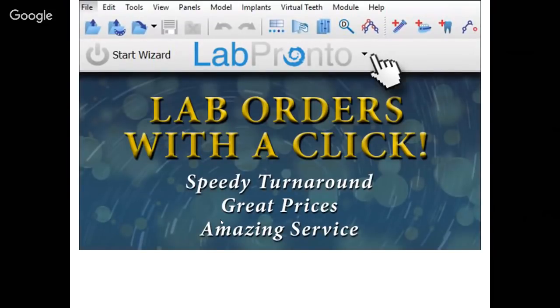So as I mentioned, the first thing that I want to discuss is Lab Pronto. You're going to see in the software, there's a new button in the horizontal toolbar, and Lab Pronto allows the ordering of lab products and services with a click.